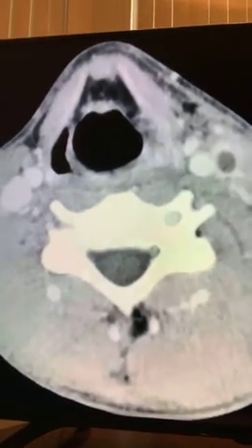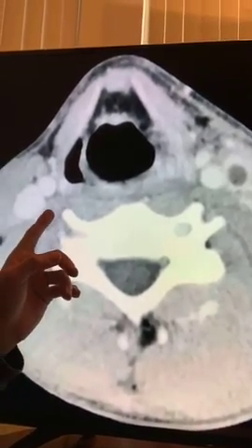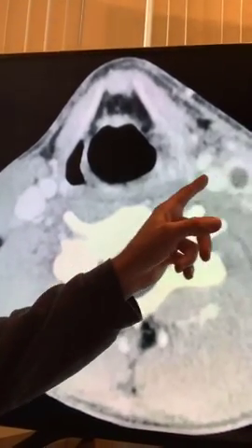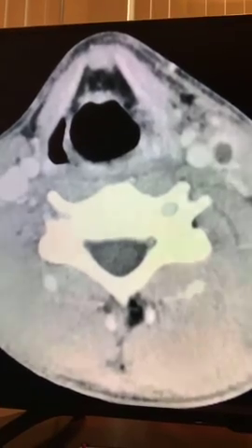So a lot of you guys found the abnormality, right? We know it's a contrast opacified exam. So this is the normal side. This is the abnormal side. So you found the abnormality. Good, awesome. But what is the abnormality? So there's kind of a wishy-washy about, I don't know what kind of vessel this is. Is it venous or is it arterial? It makes a big difference, all right? So you're thinking now, well, okay, if it's a carotid artery, I got a couple of answers for that. If it's a carotid artery, that's obviously bad.